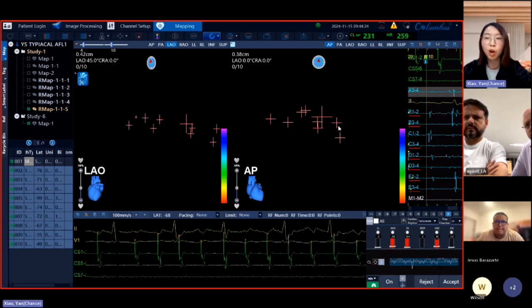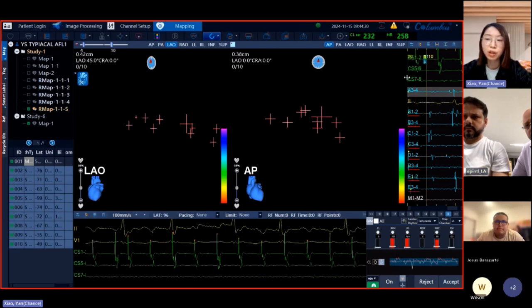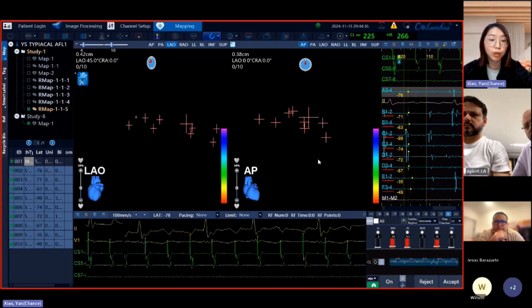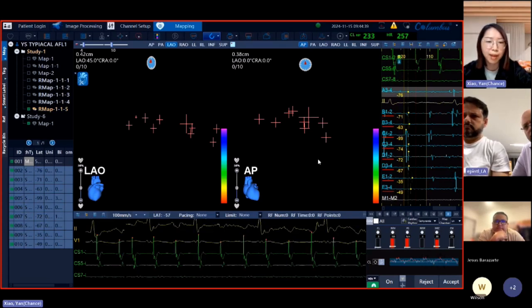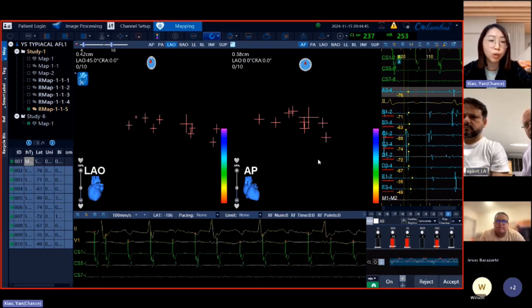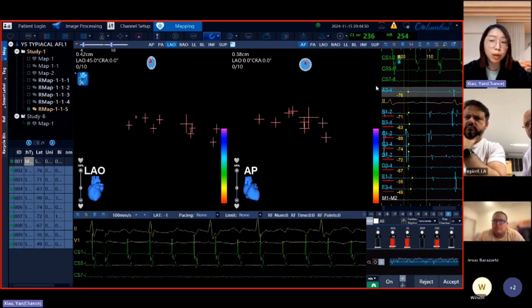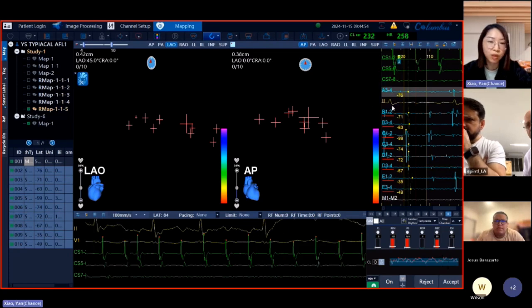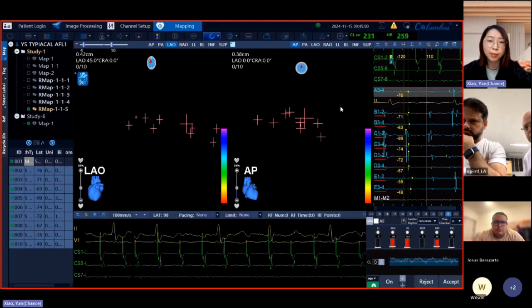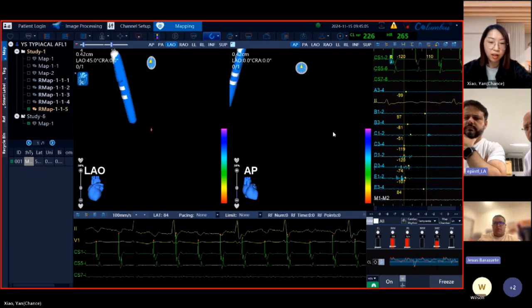Also important, for the mapping, we hope all signals are clear, and if there's some issue or some noise from some channels, you can cancel the related channel and collect an accurate map, right? It's an update. If we use EasyLoop 3D, it's the same. When we used EasyLoop 3D, it was fixed; the points we collected were also fixed for each collection. But now it's much more flexible, right? Is it clear? It's clear. Okay, thank you.